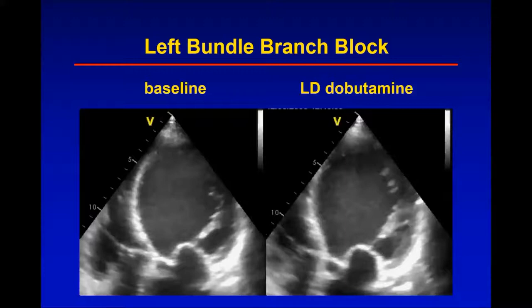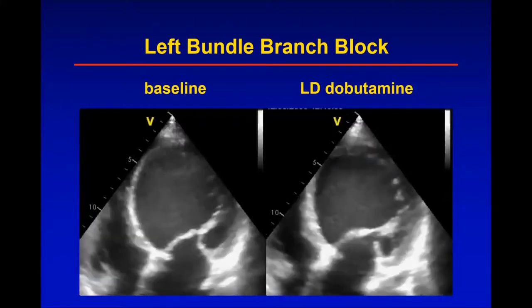You see more flash, you see more rocking, but the contraction of the chamber, the ejection fraction, the work that is performed towards the outside world doesn't change at all, because this left bundle branch block is a condition where the walls work against each other. So we have an uncoupling of myocardial function and performed work. So this global work assessment is not a good approach.